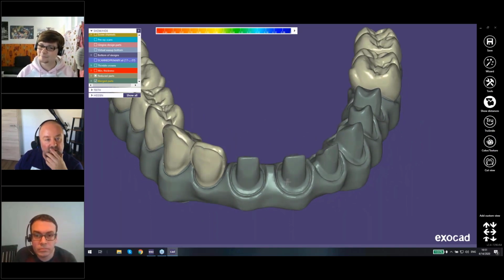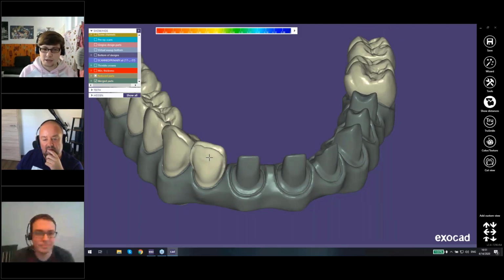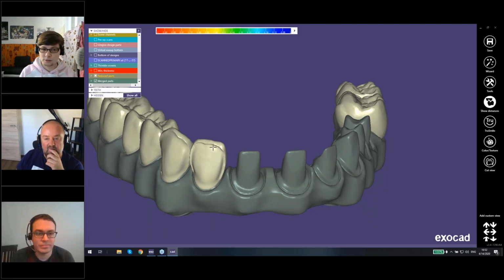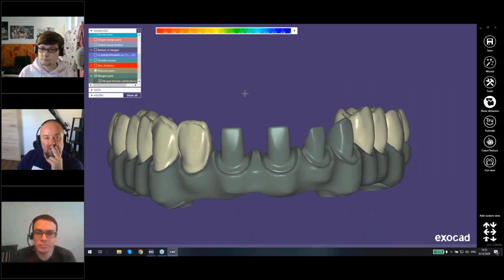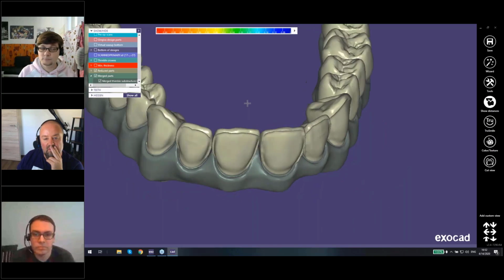There is one remark from Nathalie, quite funny. He just told me that maybe you forgot earlier to delete the merged parts to add the connectors. I thought that you did it, but they are deleted at the moment. Then it should work. They're not merged, as far as I'm concerned. No, only the substructure. Then it should work to connect them. Maybe just try again.